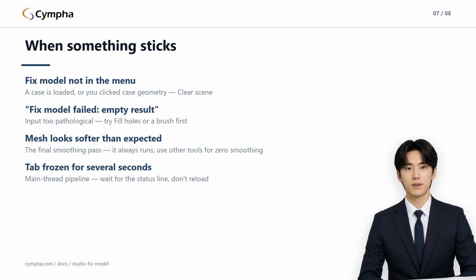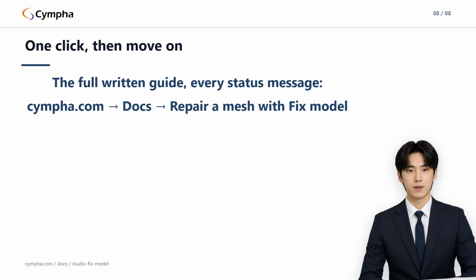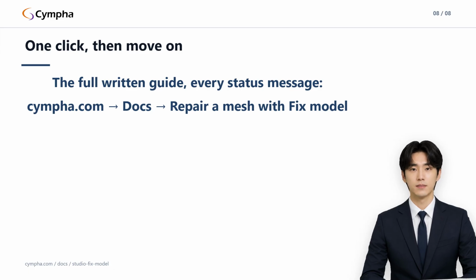And if the browser tab feels frozen for several seconds, the pipeline runs on the main thread, so that's normal on a dense full-mouth mesh. Wait for the status line. Reloading the tab mid-pipeline is the only way to actually lose work here.